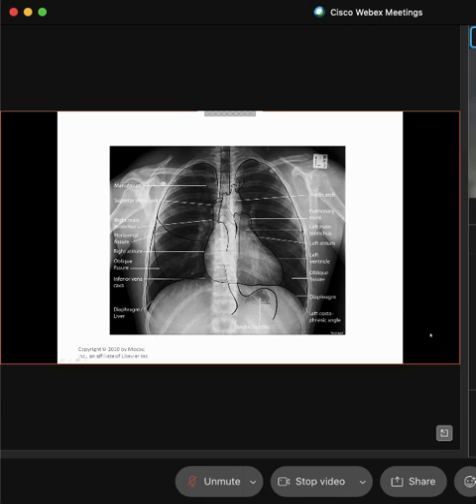T1. Perfect. Now, let's take a look here because we know that we should not see any more trachea as we get down to where our diaphragms are or where our liver occupies, right? So we no longer see the trachea, and we see a larger, wider heart over the lower part of the thorax. So these are key anatomy points that let you identify how inferior we are versus superior. Make sense? Good.